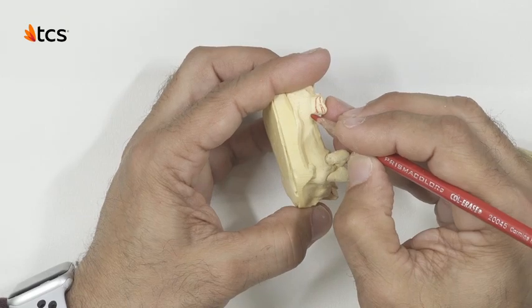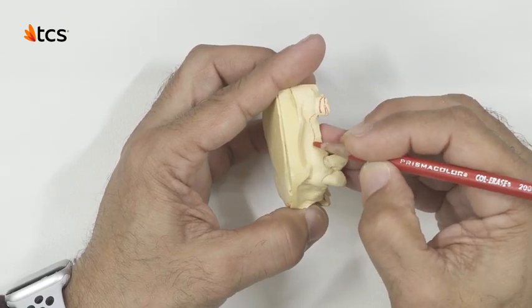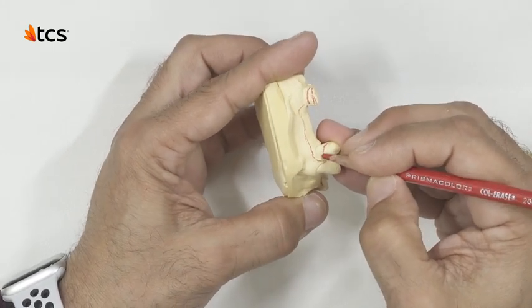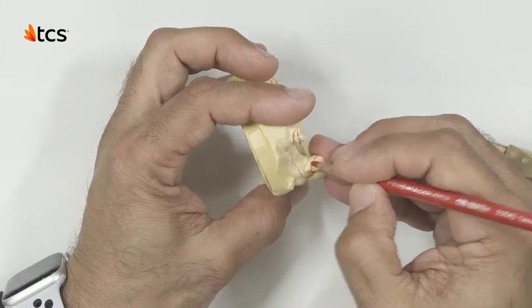We continue our design by creating another high finger clasp design on this molar, following the height of contour as we mark our design line throughout.